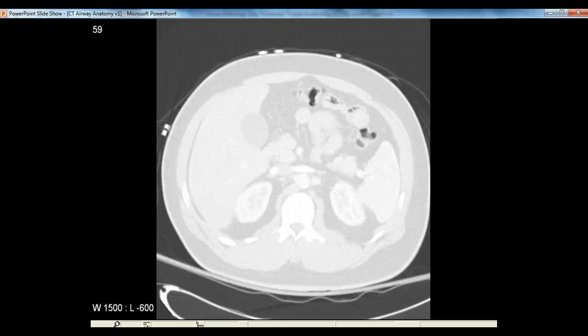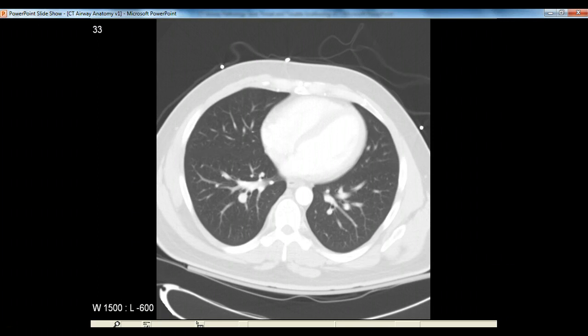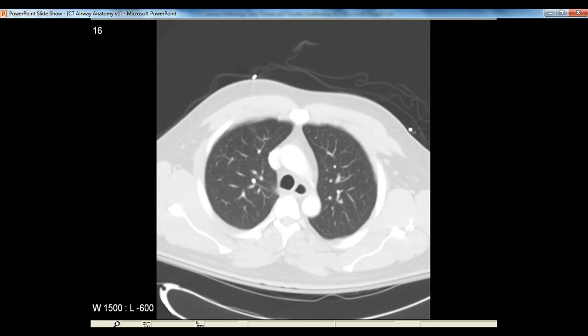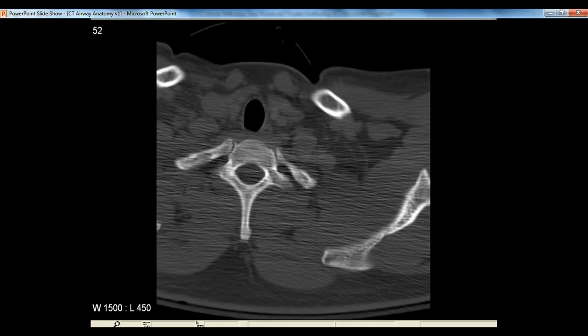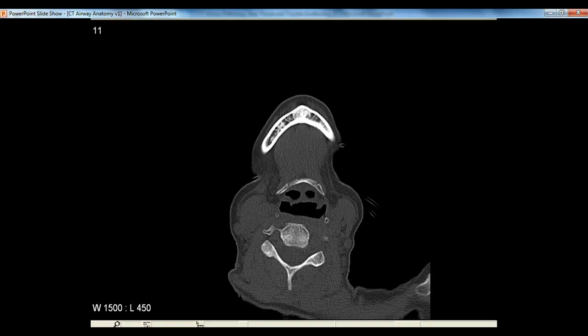So that is your airway from top to bottom. We're going to go through to the beginning, and then we're just going to kind of come down like a movie. You can watch it flash its way through, get a sense again of the relationships of the structures of the airway, and hopefully this will make you feel much more comfortable with what you're doing when you're managing an airway, what the relationship of all the various structures are to each other.